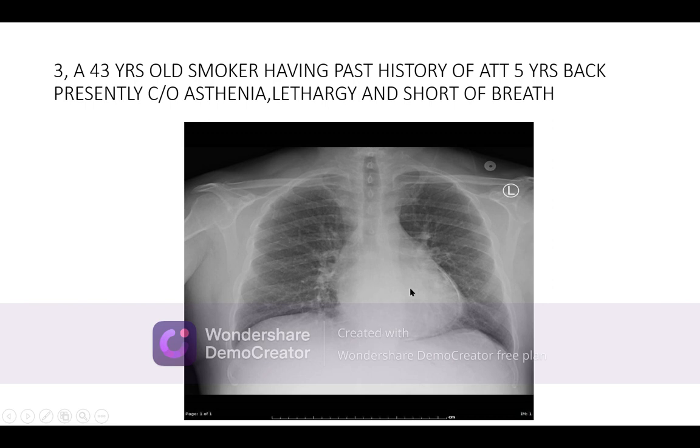So chronic constrictive pericarditis. It may be possible that the fluid is very little, depending on the echocardiography. If enough fluid is there, go for therapeutic pericardiocentesis and see what is the cause behind it. So this case is described, and the diagnosis is very clear cut. Etiological differential can be made. In this country, tuberculosis is the cause, because he has also taken the ATT. But other diseases can cause the calcification.